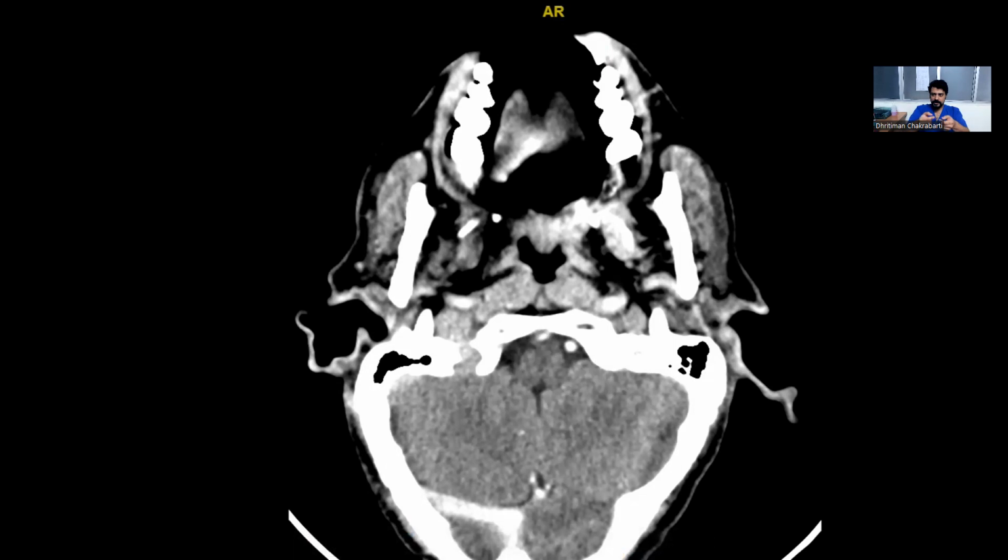Now, what happens is that as you reach the pons, there are dense pontocerebellar connections to the back. So when you see the brainstem and the cerebellum merged, that basically means you have reached the pons. Along with that, you will see a diamond shaped, circular or squarish structure here.